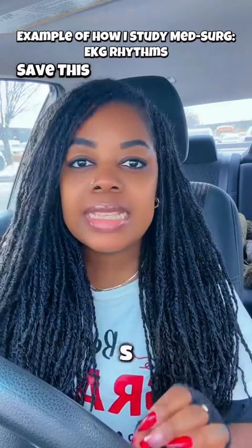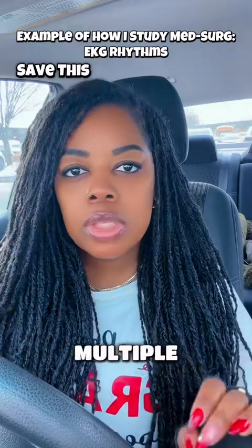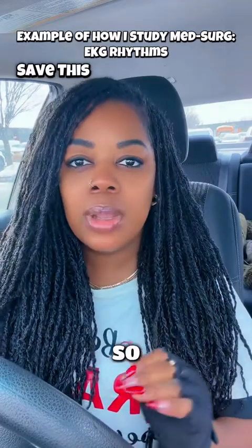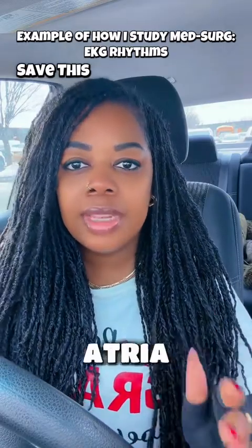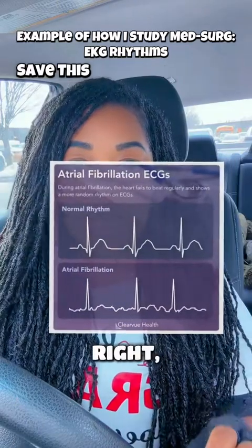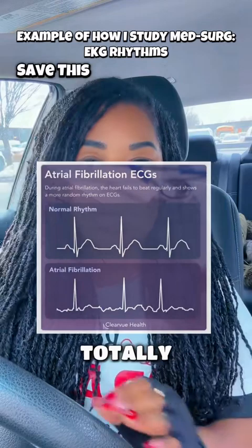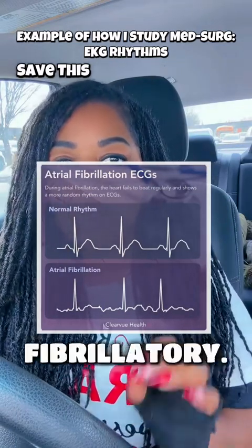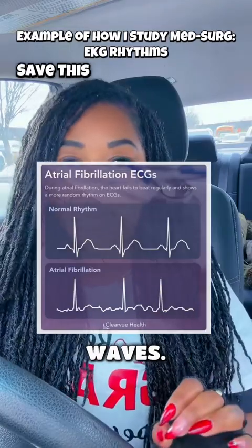So basically, the SA node loses control and multiple irritable spots in the atria start firing like crazy. So instead of a clean contraction, the atria just quivers. So on your EKG strip, right, this means P waves are totally absent. They're replaced by messy, wavy lines called fibrillatory waves, right?